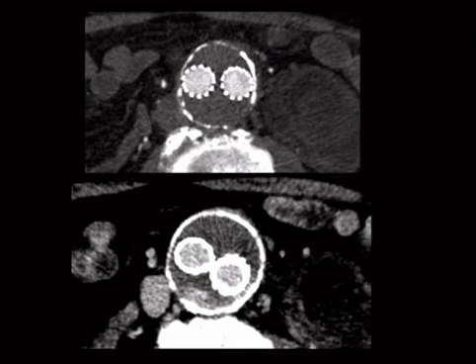If it's getting larger, that should tip you off that there may be an endoleak, which is the second thing you're looking for. And for me, I think the easiest way to tell whether or not there's an endoleak is to compare the density within the sac on the pre-contrast to the delayed. And if it's increasing, that means that you're leaking contrast. So in this case, we can see that there's contrast here on the delayed that wasn't present before. So this is an endoleak.